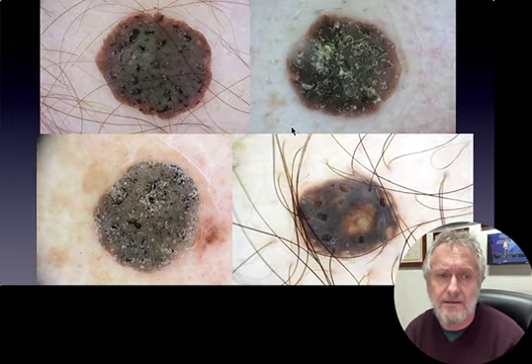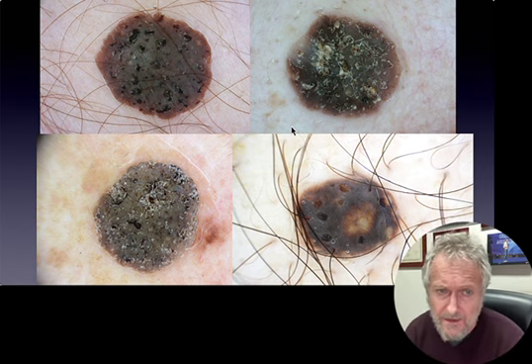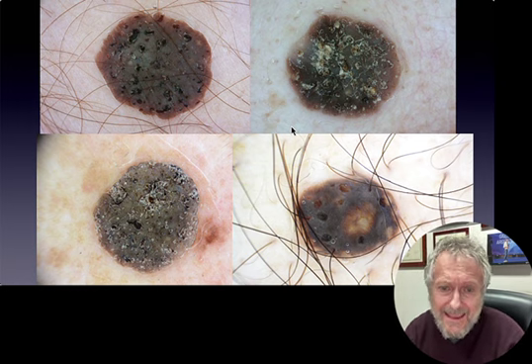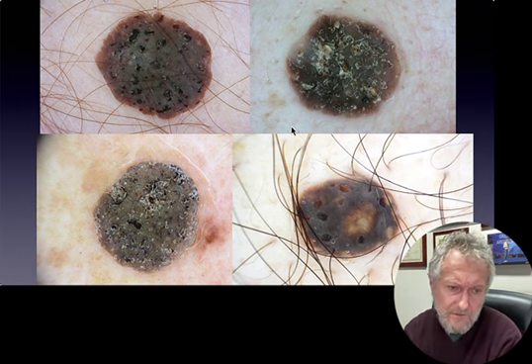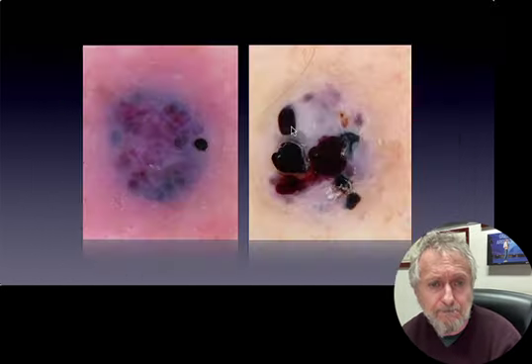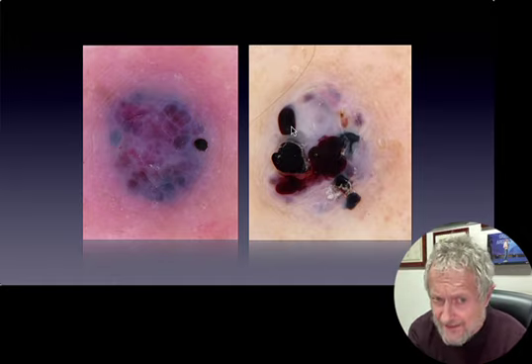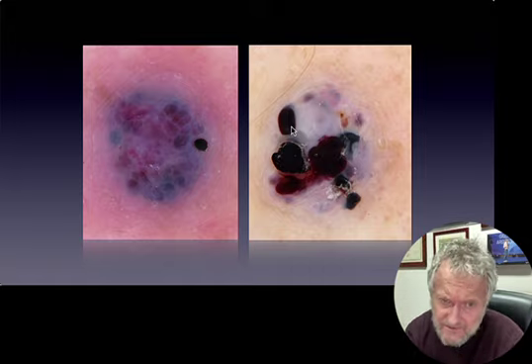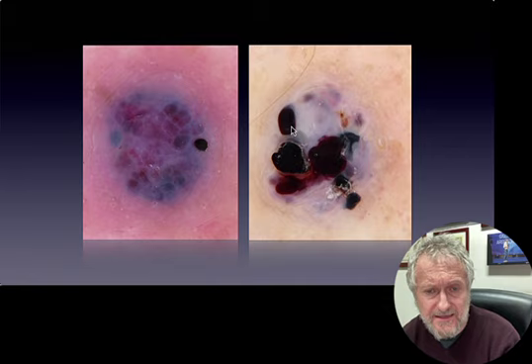Okay, so here you see examples of blue and black lesions, so lesions positive to the blue-black rule, but as you can see clearly in all these cases, the black component can be easily identified as a specific structure of seborrheic keratosis, namely multiple comedo-like openings. Okay. And here two examples of hemangiomas in which you see a combination of blue and black, but again the black coloration is recognizable as a specific structure we find in vascular lesions, which is the presence of lacunas.